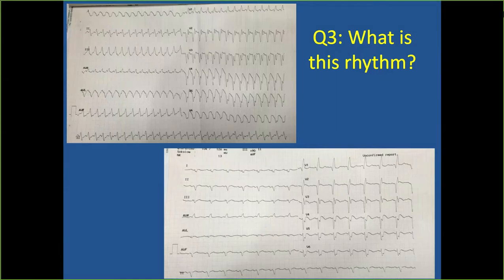We learned axis shift of more than 40 degrees from baseline. There is the axis shift of more than 40 degrees. This says there's a VT. And in a patient, look at the sinus beat: if there is a Q wave in the ECG and a QR during a VT, it localizes the VT. It points more towards a VT. That means there is a structural heart disease. So there is AV dissociation. The A is the right answer.